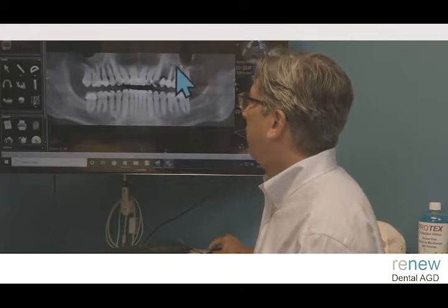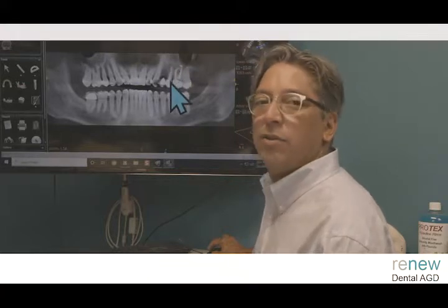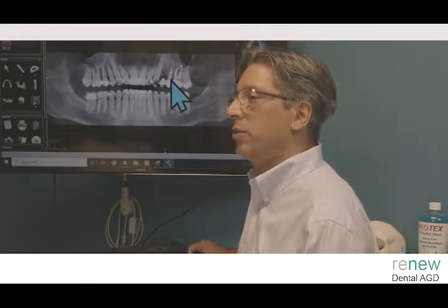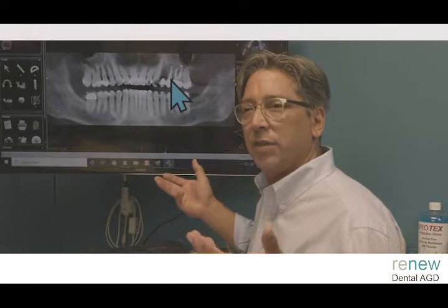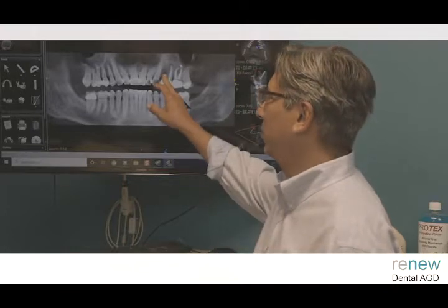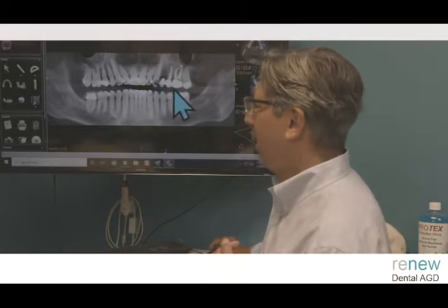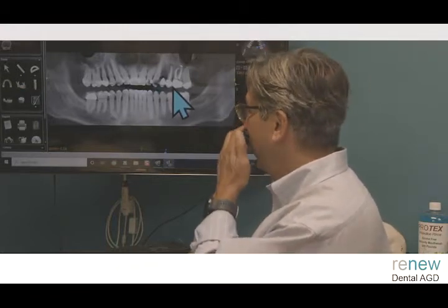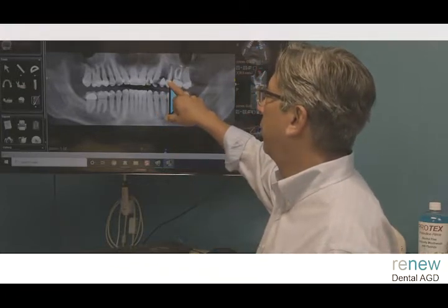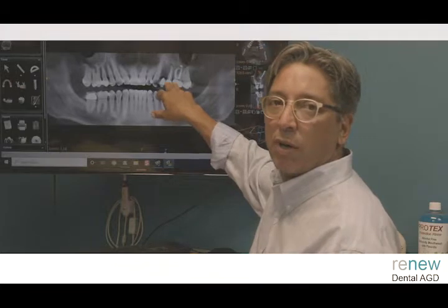And I'll explain it mainly because of that sinus involvement here with this infected root canal treated tooth. I call this a classic because it is one of those scenarios where the doctor didn't have the tools available to restore this, meaning an implant in this scenario, and decided to not do a 3-unit bridge between the canine and the premolar, which would probably have been a healthier scenario than this failing because of the recurrent decay between 13 and 14 because it's cantilevered or splinted here.